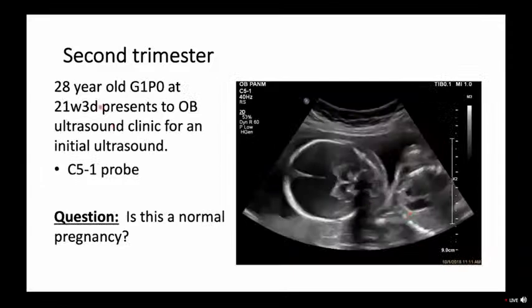All right, one more case about the fetal head. 28 years old, gravida 1, para 0, 21 weeks, 3 days. She's here for her initial ultrasound, and you put the transducer down and you see the image on the right.